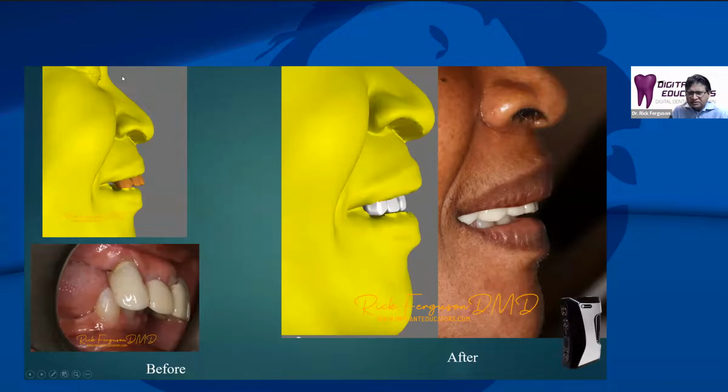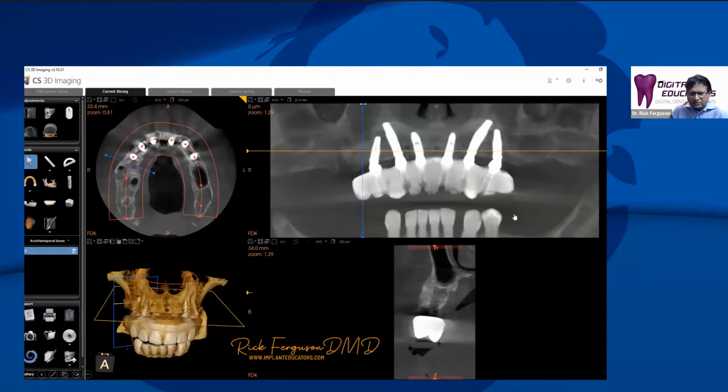And one of the things you'll see here is if you go from this image to this image here with the orange teeth to the white teeth, there's a big discrepancy there. It doesn't look as much here because actually the lip support was reduced, so the lip actually came back to where the white teeth are, but it's pretty close to what we wanted as far as the amount of retraction bringing those teeth back. And that's what the post-op x-ray looks like.